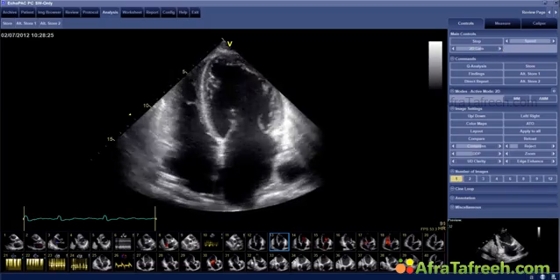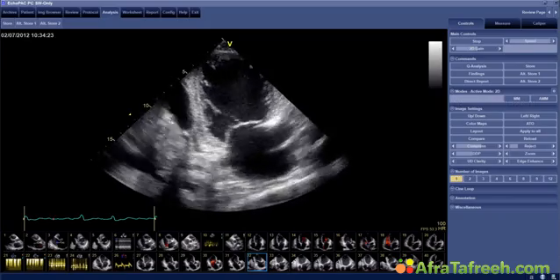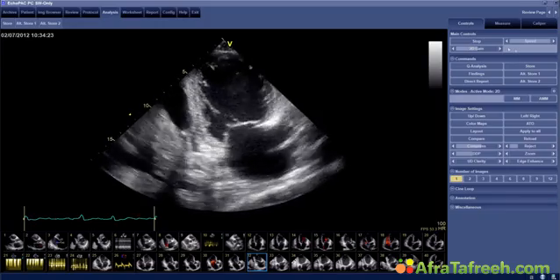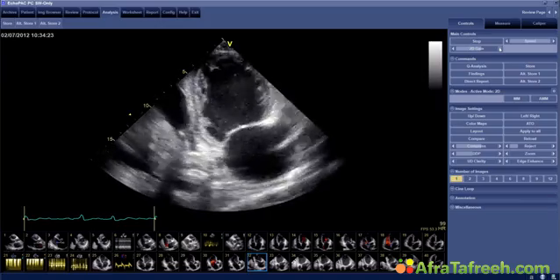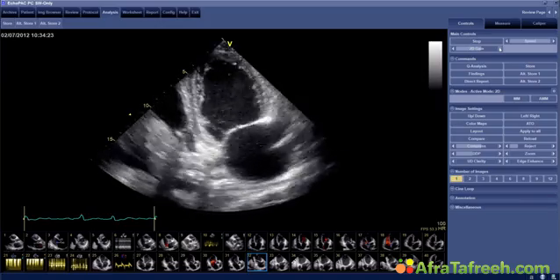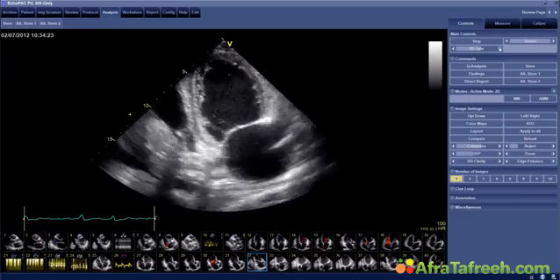Yvonne, you see pleural effusion, and you are correct. This here is pleural effusion right here. Can you see this? This is part of the lung, and this is fluid here. Very good, actually, because these are the things that you should notice on a normal echo. Pleural effusion is something that I always tell my students: you have to find a pleural effusion with echo. Echo is the ideal method to look at this. So very good, Yvonne. Right here is the pleural effusion.